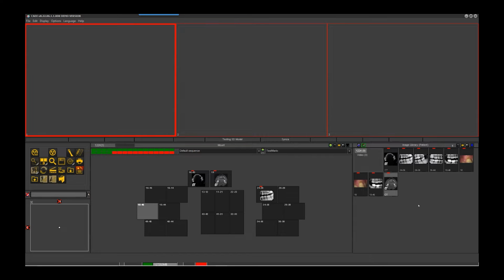So there's no way for any of these files to then be bridged to Open Dental to be put into, say, this is ortho. So we've done this for an ortho patient, and now I have their ortho file under images in Open Dental. I'm not able to move it into that file, correct? Yes, you can. You can export with just a few clicks any image into any other program.